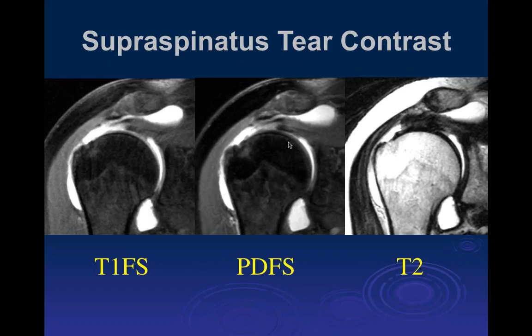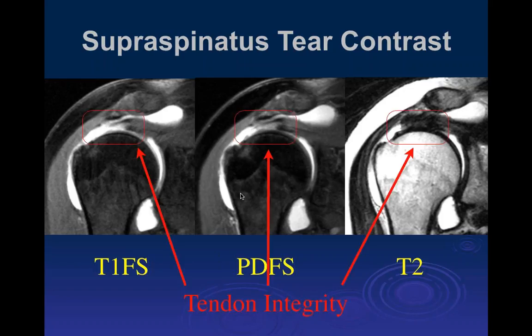But this is an operative case if the muscle is okay. Yeah, my guess is the muscle is going to be okay. We don't see it here. I'm sorry, when you see this much separation, you have to be prepared for quite a bit of work. So. Okay, good.